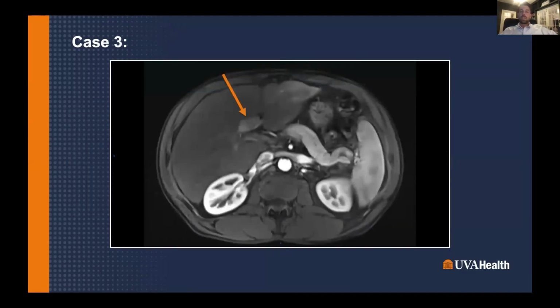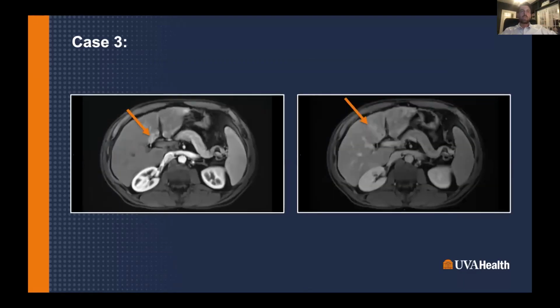Last case shows a segment 4 LI-RADS 5 lesion, also treated with Y90. This was imaged 1 month after treatment. The lesion was again noted to be arterially enhancing and washing out, which was read as evidence of viable disease. This prompted immediate and likely unnecessary retreatment with TACE.